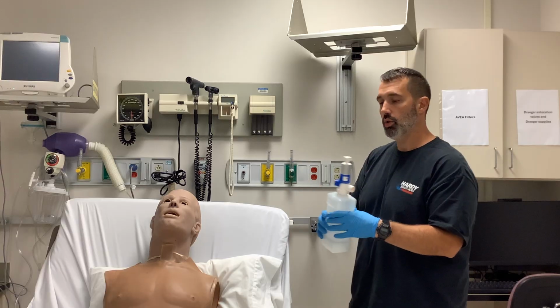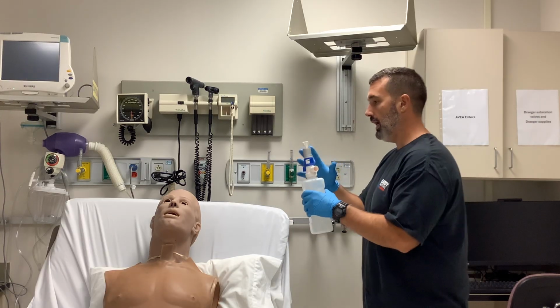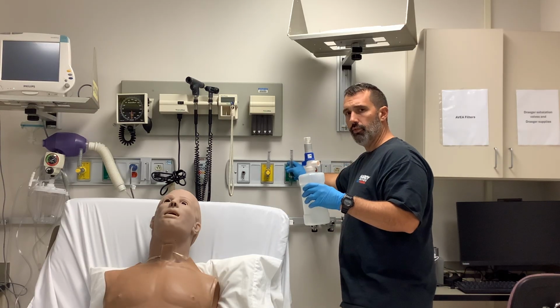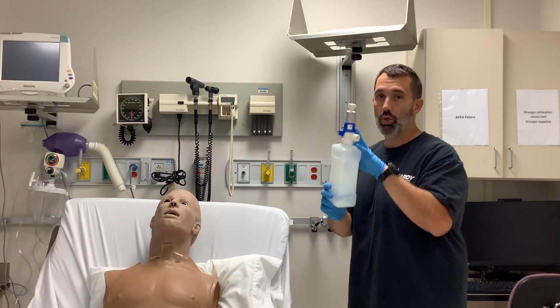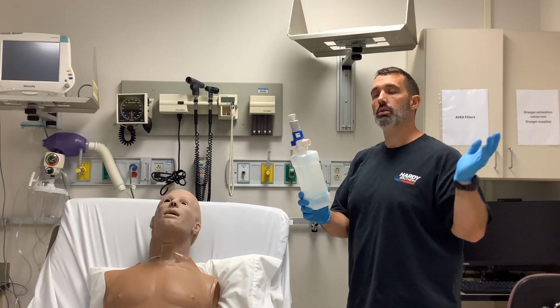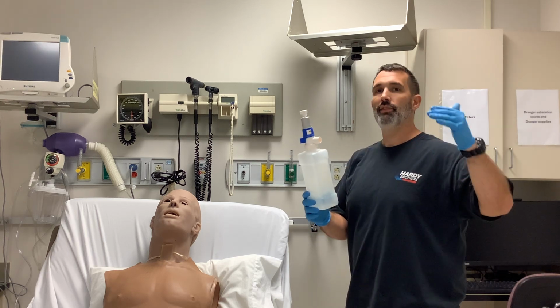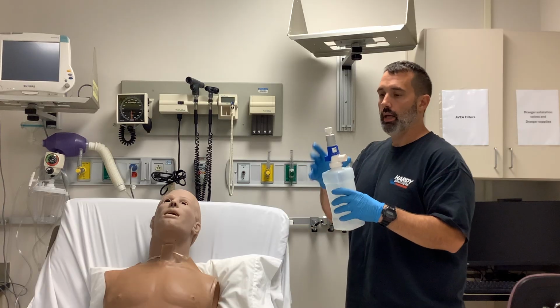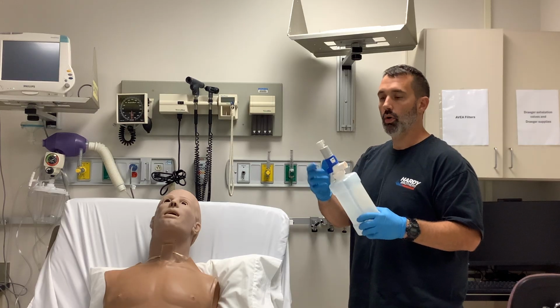So the only way in which you can get one of these desired additional percentages of oxygen is to have this appropriately attached to an oxygen flow meter. Now, are there any scenarios in which you might actually place this on just an airflow? Let's say the patient doesn't need supplemental oxygen; they just need a cool bland aerosol, so they don't need any higher amount of oxygen or higher FiO2, if you will, than 21%. Then sure, you can put this on an airflow meter and turn it on.